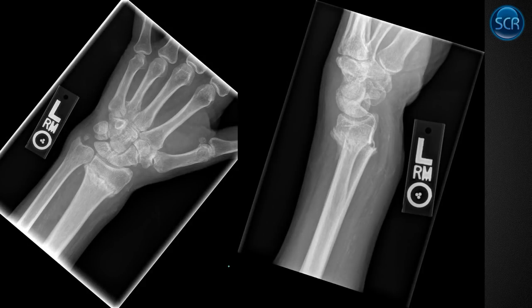All right, so now we're getting into the wrist, starting with trauma. It's very common to fracture your distal radius. When you're an adult, one of two things happens. If you fall on an outstretched hand, straight up in front of you, that impact is going to push your wrist back and fracture through your radius and cause dorsal angulation. So this is a Colles fracture. Posterior angulation fracture, you can see it across.